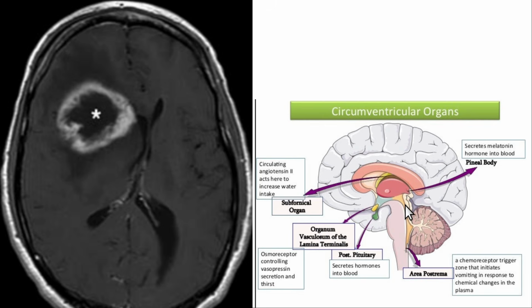So anyways, this was just an introduction to give you a clue when I talk about brain MRIs, because I want to talk about more advanced brain stuff. And I have to have this intro lecture so that people can get a clue real fast. And the most important thing to know out of this whole lecture is that T1 is dark signal for fluid. T2 is bright signal for fluid. In general, in all of MRIs, as a matter of fact, in every part of the body, what you want to do to diagnose a disease is increase the signal of the disease and decrease the signal of the background on that particular MRI image. So, hope that was helpful.